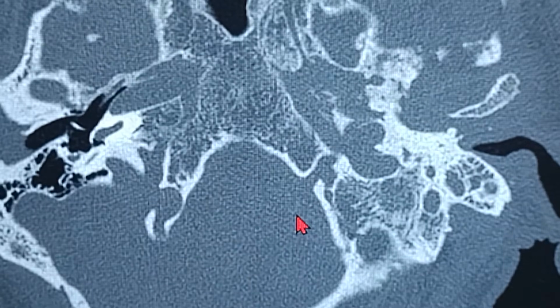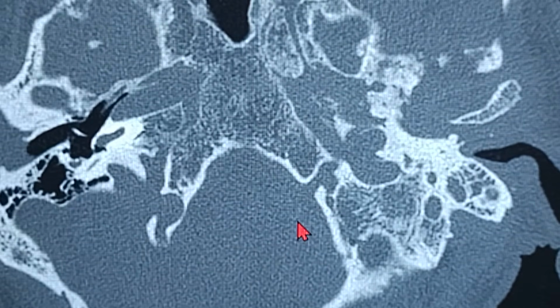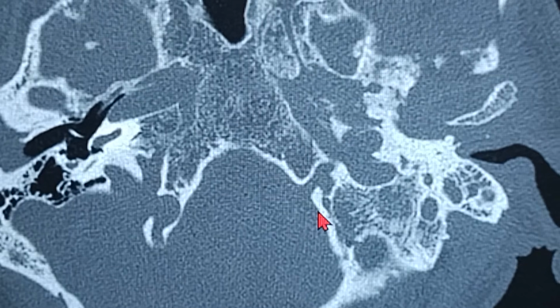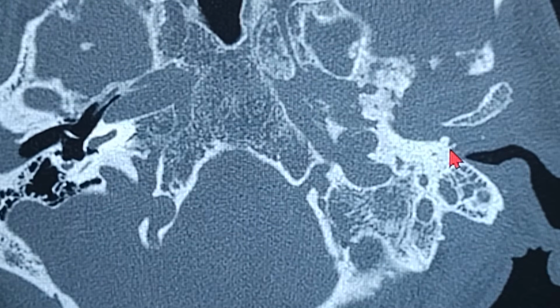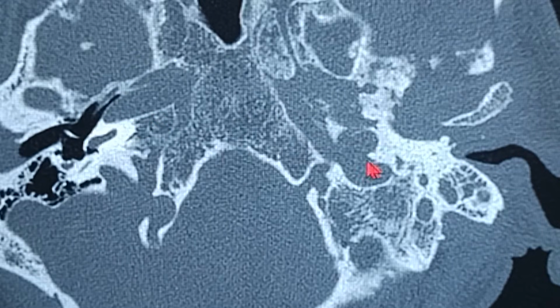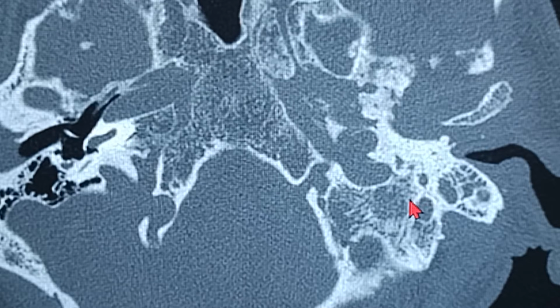I'm going to keep the two sides for comparison, and in the next 5 minutes cover the diseased part. You can see this is the normal side, and that's the affected side. This is basically a tilted scan, so you're not going to see a real-time differentiation over here because this side is tilted. You're going to see that after a little bit of time.